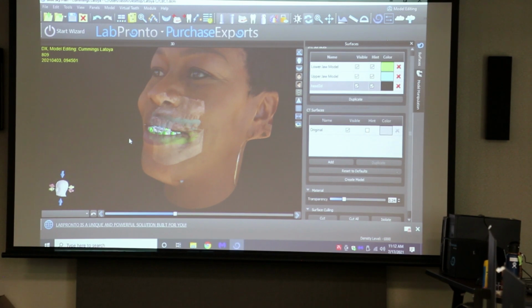It takes really soft pictures. And this is where, honestly, we're so limited photo-wise. I don't know how big a field of view you have access to. It's not very big, okay, so this is what we have. Now, again, like I was saying, this isn't built for surgical guide. This is just giving you some good face scan so that you can idealize where you want teeth, show the patient. It's just a cool adjunct. The face scan is definitely a bonus rather than a necessity.